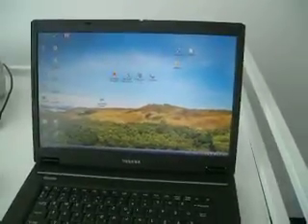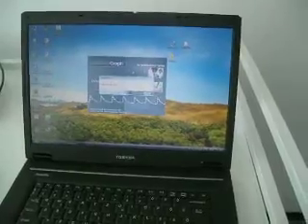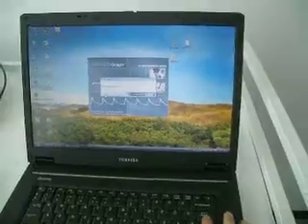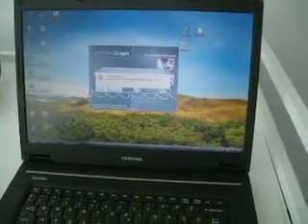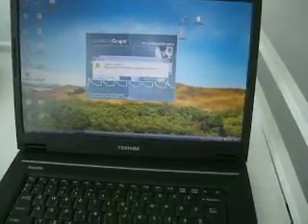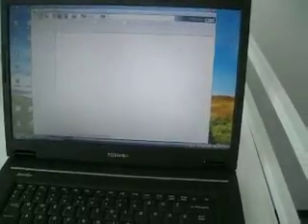To open the Arteriograph software, double-click the Arteriograph icon and a login dialog window will appear. You can simply press OK to log in with the standard login name. Just click yes the next time. Now you are entered with the default login name called Arteriograph.